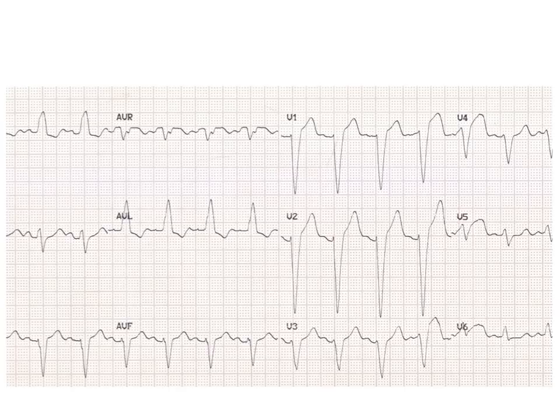So, all right. So now here is a different EKG, and this is the last one in this video. I want you to tell me what you think's going on here. You give 5 seconds. Time's up. So what this is, this is a left bundle branch block. There is no pathologic cardiac event happening here that we can see with like ST depressions or things like that.